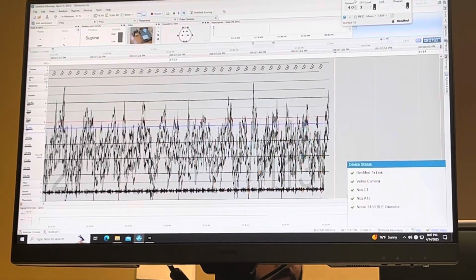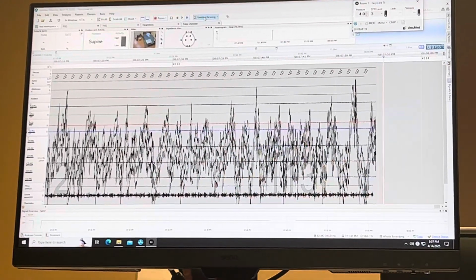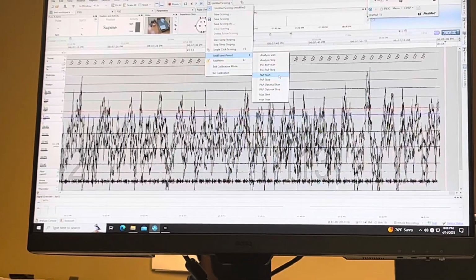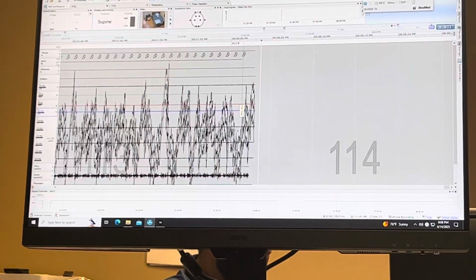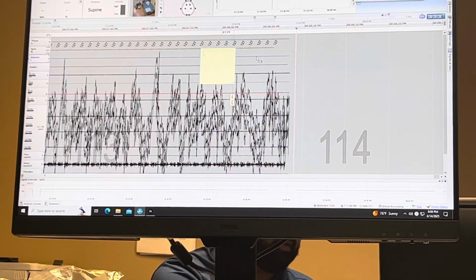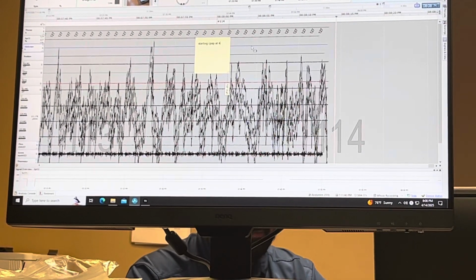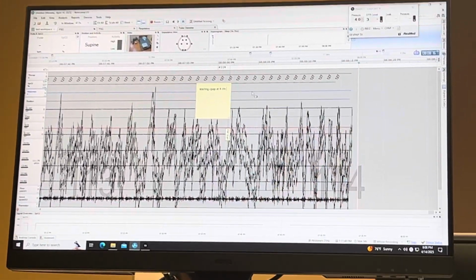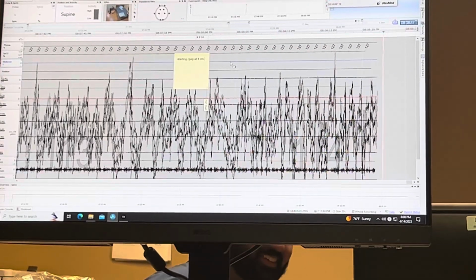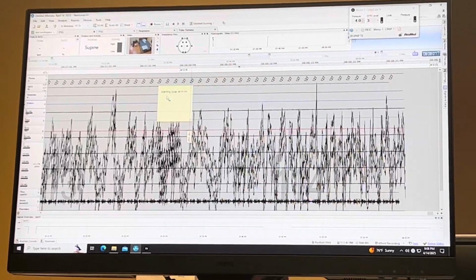So we've added our bedtime, we've got everything connected, so now in scoring, add event period, and now we're going to add PAP start. And now our titration section is starting from here. Again, just to make sure that everyone knows what's going on, F2, starting CPAP. I already see it, it was glowing. Nice big sticky note. And so you can stick that in there.